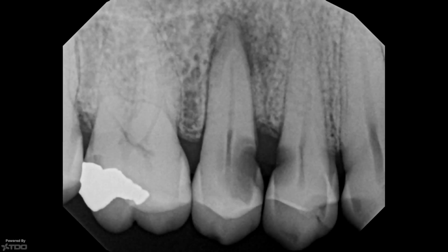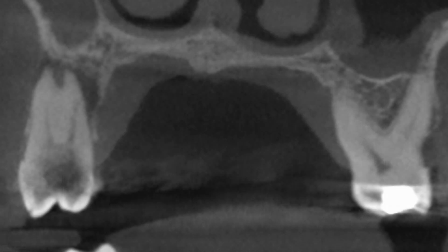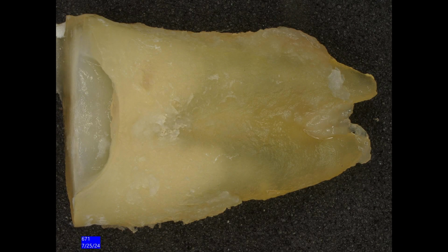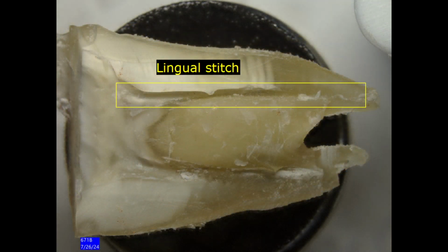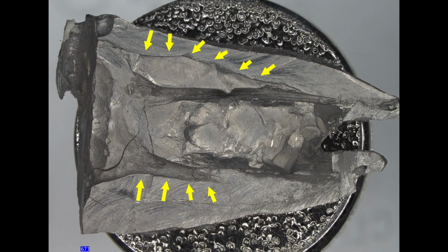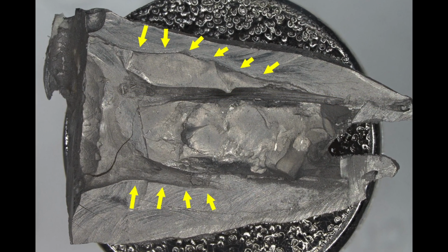I'm going to make several inferences here. I'm going to infer that this canal was completely necrotic and that there were bacteria present in the canal. When we sectioned the tooth, we couldn't get a very good section because it's such a broad root, and we really only got one side that was fairly decent. On the other side, the buccal side, the sectioning disc had to go into the canal.